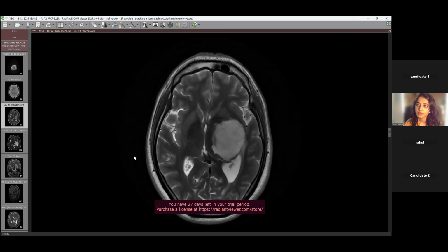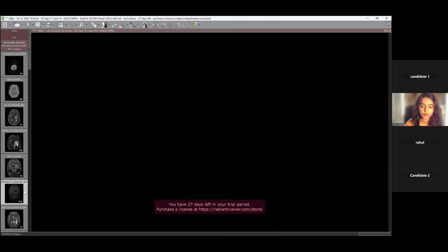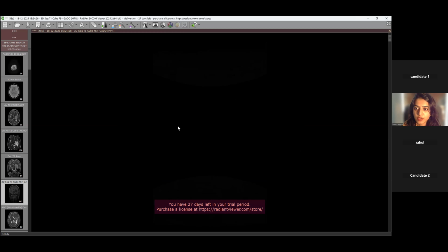Two minutes, last two minutes. Okay. Can I see the FLAIR, please? And the contrast enhancement, I think you can go with the coronal. Yeah, that would be good. Coronal contrast. It was hyperintense on FLAIR. Yeah. It's not loaded. One second. Leave the mouse. I have it.